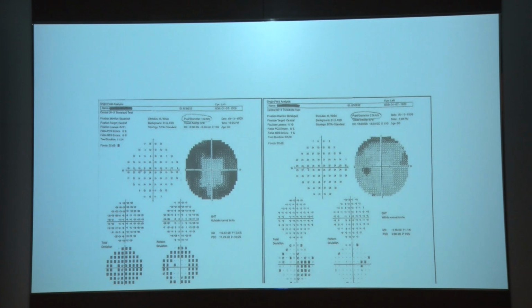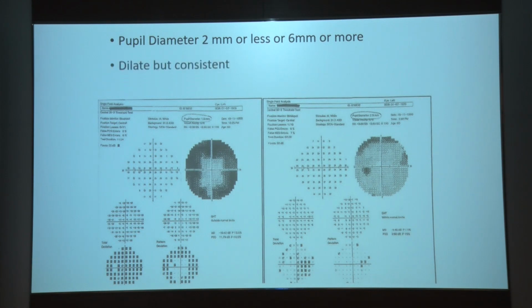So what is here? Are you looking at the pupil diameter now? It's the same patient on pilocarpine for the last 30 years. This is pilocarpine for the last 30 years, that eye, 1 millimeter pupil. Maximum dilatation is 2.5 millimeters. Right, so this is the impact of pupil. So a large pupil is not as bad as the small pupil.